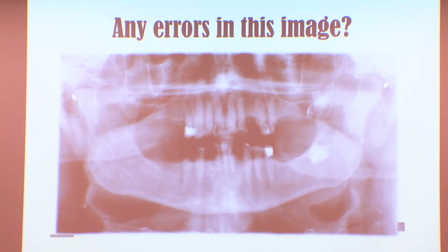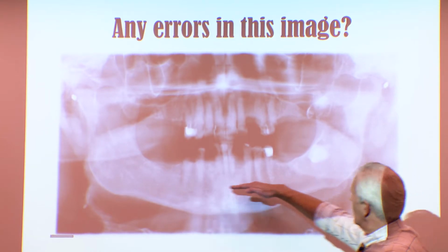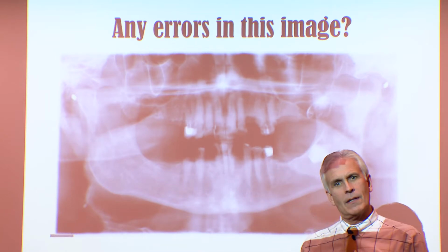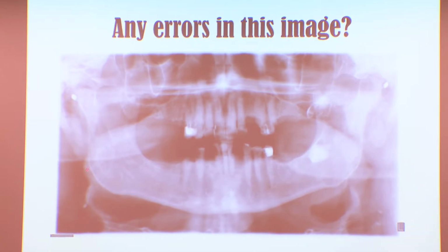If you look at the ghost images, so the ghost here, the ghost here, they're offset. So the head was tipped a little bit. The ghost of the angle of the mandible right here, over on the side here. And then this one is this one here.